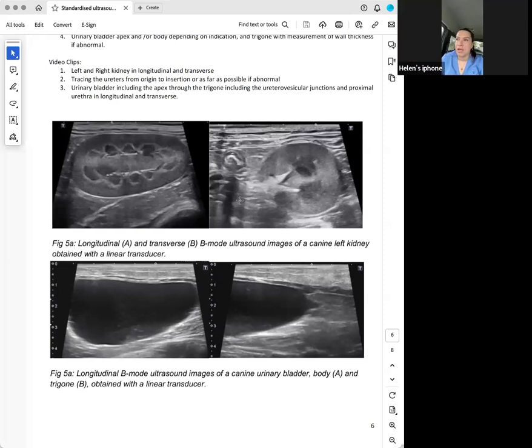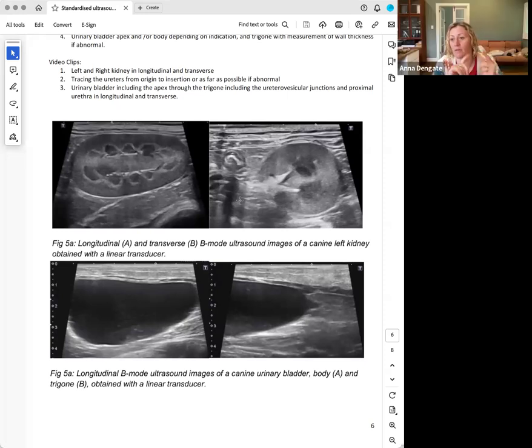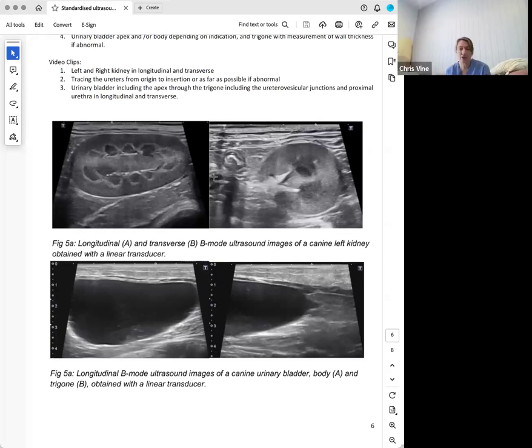You could have increased infiltrates, so increased cellular material, like lymphoma or something like that. Yep. Excellent. So infiltrative disease is one of the differentials for normal to big kidneys with hyperechoic cortices. What about when we've got a bright white line just at the corticomedullary junction or just inside? A medullary rim sign. Can be very normal.